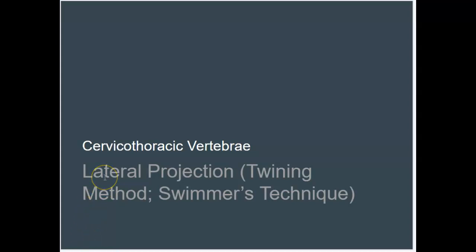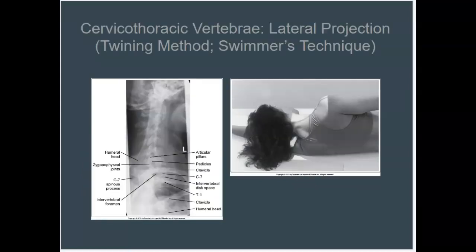Welcome to part 2 of the T-spine slash cervical thoracic spine swimmer's view projection image analysis. Let's talk about the image analysis guidelines for our swimmer's view.